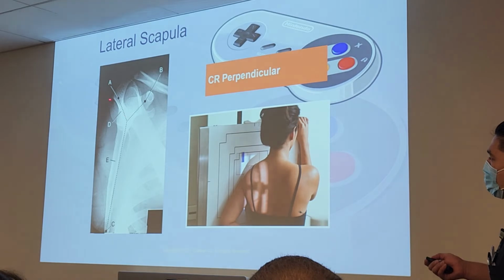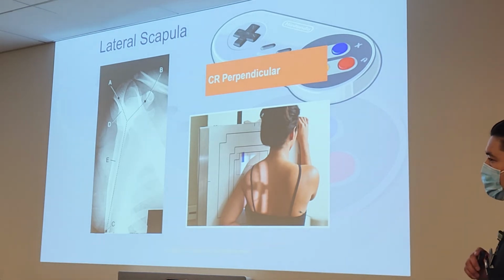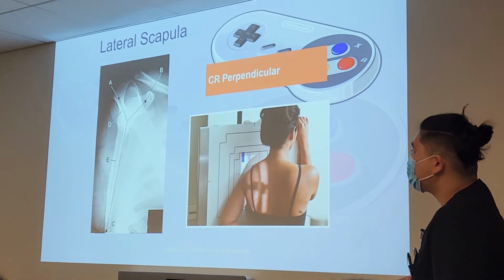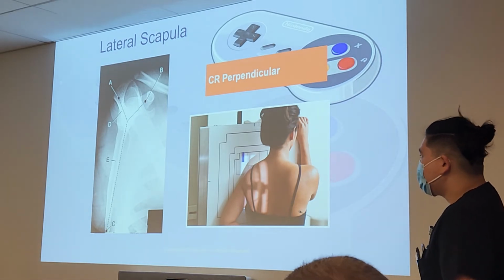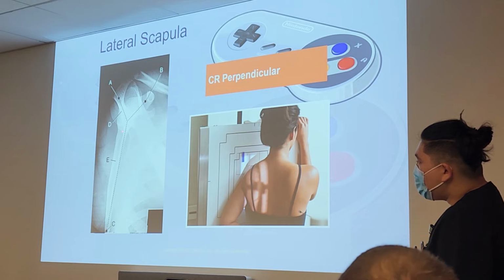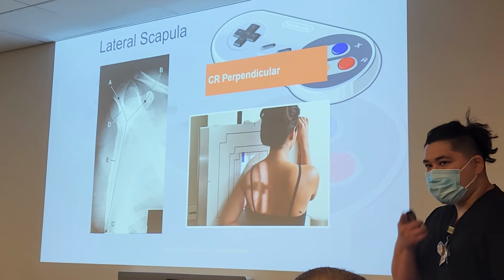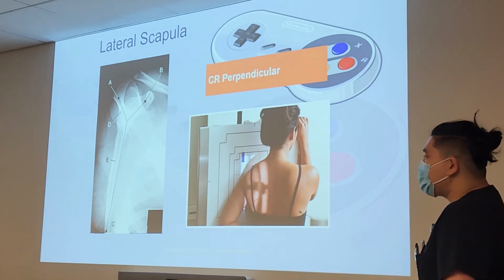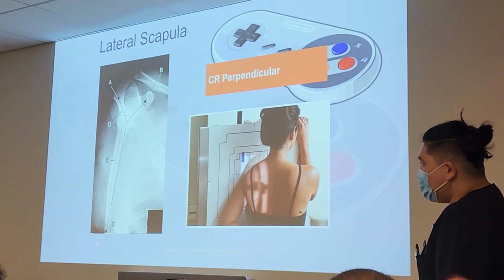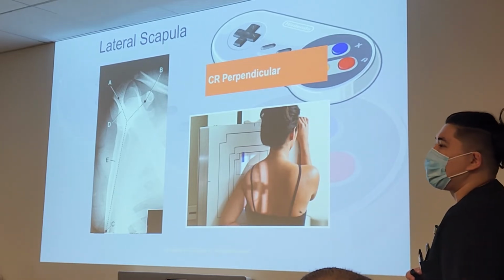And D. Some of this portion here. That's the only view we can see that anatomy. Scapular spine. We can only see it on this view. Going down all the way here, this portion E. Body of the scapula, superimposed, body of the scapula, correct. And all the way down here at C, inferior angle. Inferior angle of the scapula.